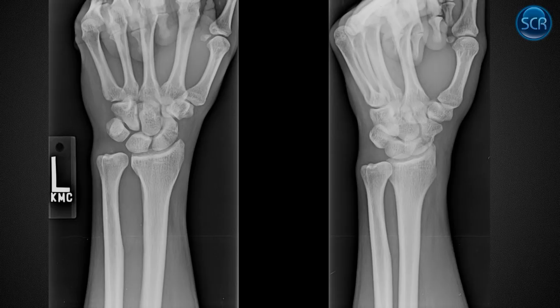Here's another example of scaphoid fracture. Again, you can see there's some abnormal density here, and then on the oblique view, sometimes ulnar deviation, whatever view you see it on, we have to see this lucent line, usually traversing the waist. It can be a little more proximal or distal, it can be anywhere, but this is a typical example of a scaphoid fracture.